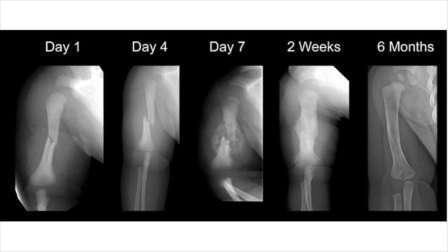You see the bone just becomes normal, like this bone never had a fracture. But remember, this is a child. In children, this process is very fast, and the remodeling phase is very, very good.